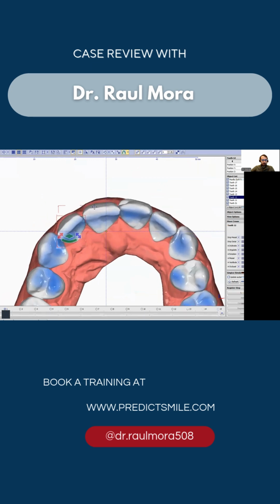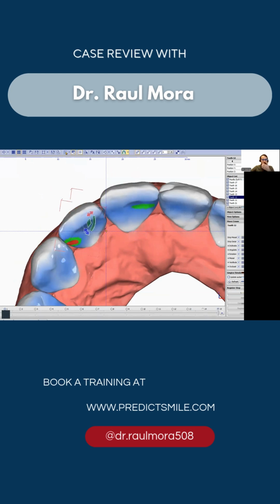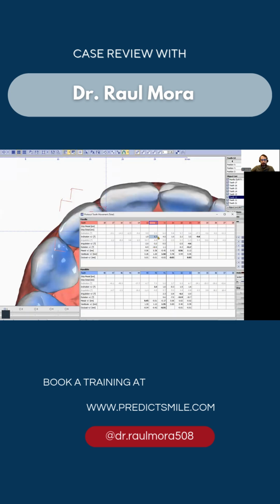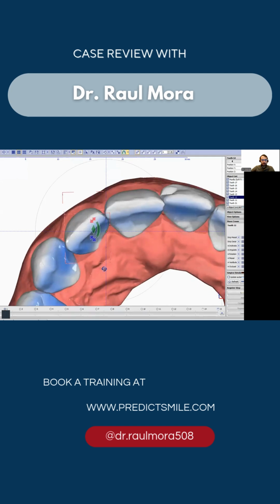So in step one, in our staging, what we are going to do is add the movement from the very beginning, but we have to check initially how much, if you have some sort of proclination, which is a movement that I would do at the same time. So we have 6 degrees of proclination and 10 degrees of rotation. So initially, we're going to do that.